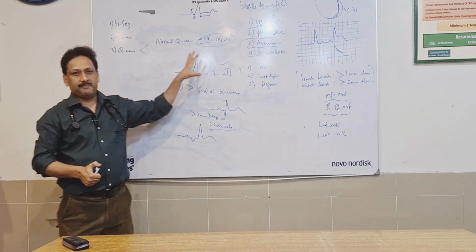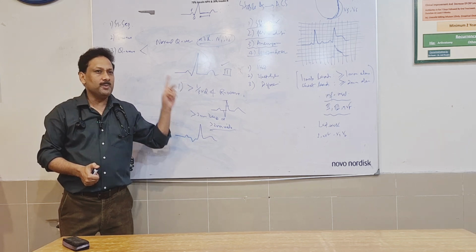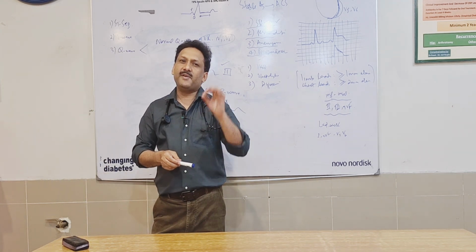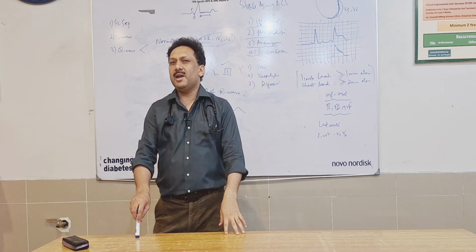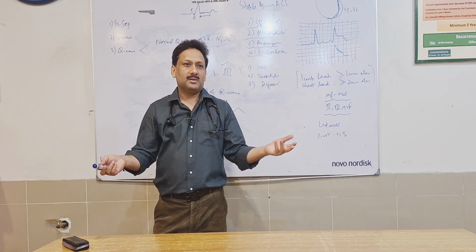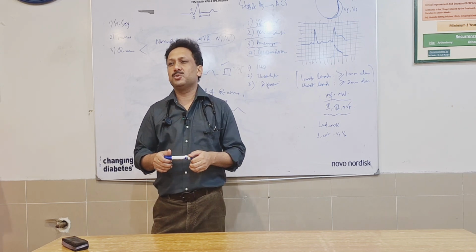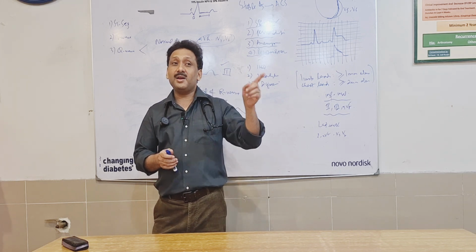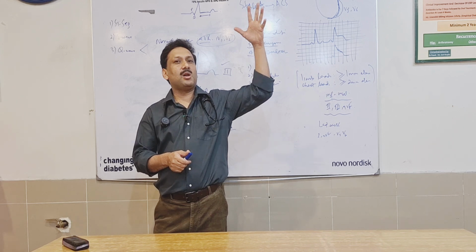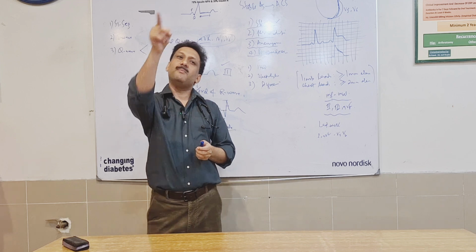So that's the story. Again, this Q wave should be seen in two adjacent leads. Like if a person has Q wave formation, one in lead AVF and another in lead V4, how important is it? It won't be that important. It won't signify a major issue. But if it is there in lead 1 and AVL, now this is very important. It represents an upper lateral wall old myocardial infarction, highly likely.